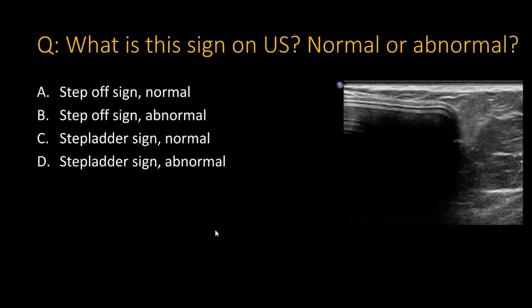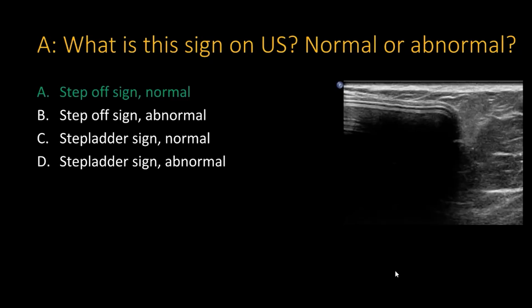Question: is this sign on ultrasound normal or abnormal? Let's see your answers over here. Okay, we have a little bit of a split. Maybe some are confused between the step-off sign and the stepladder sign. All right, let's review the results. The correct answer is A. This is a step-off sign.